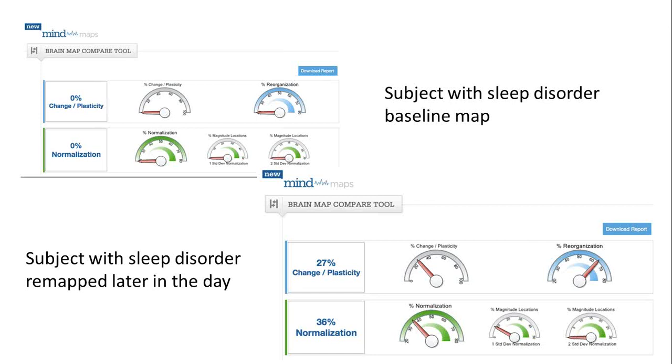They may have had an anxiety disorder. The slow wave slowed them down. You wouldn't think about that, would you? Wow, my anxiety patient got better. Yeah, because you mapped in the afternoon, there was more slow wave activity, and it overwhelmed the beta activity, which reduced, and so everything looked better. Nope, it was just the map that did it.